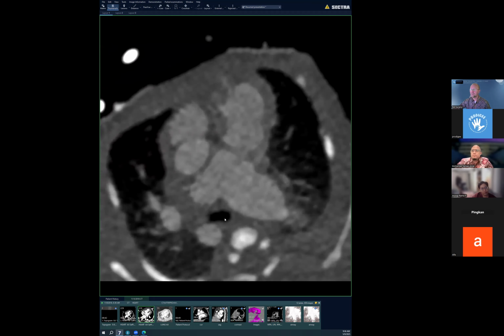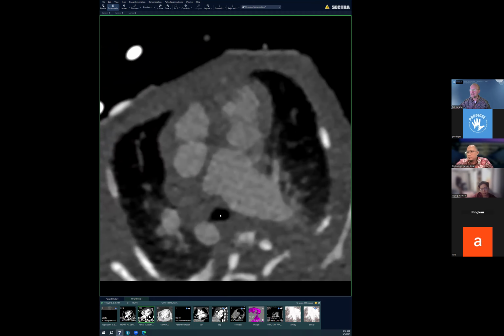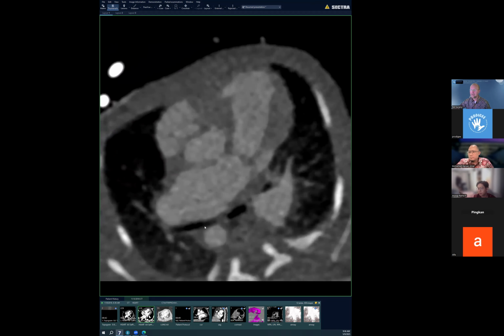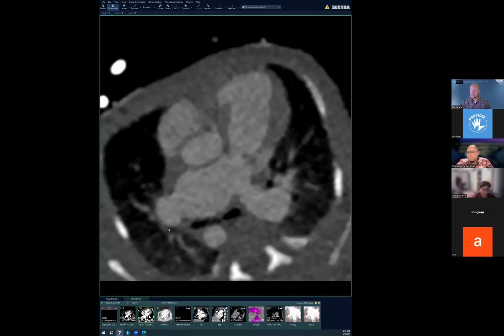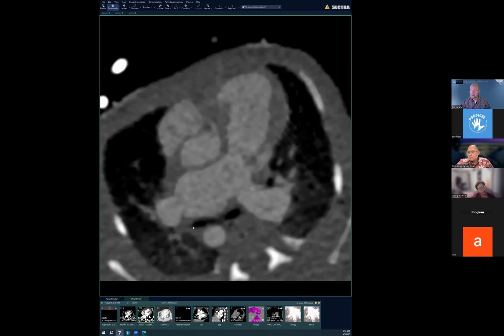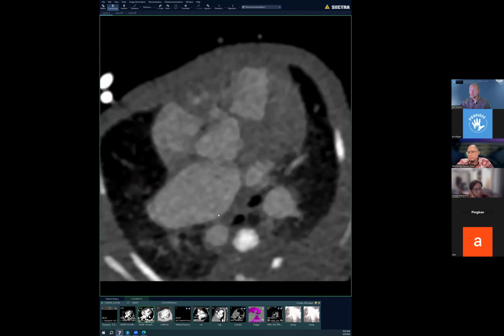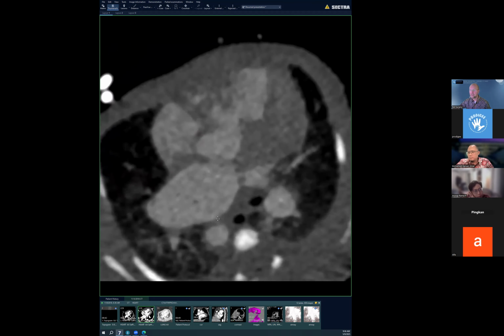So let me scroll up from the distal trachea as we're scrolling down, carina right here. Right main bronchus, upper lobe bronchus takes off here. Then you get into the bronchus intermedius, which goes down almost to nothing due to this very, very large right pulmonary artery. And then you see the right middle and lower lobe bronchi here.